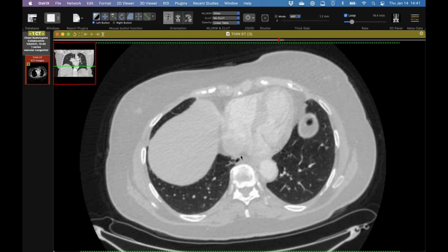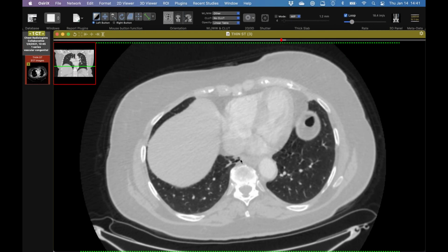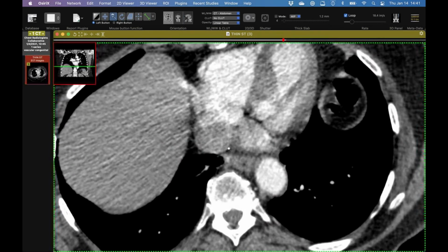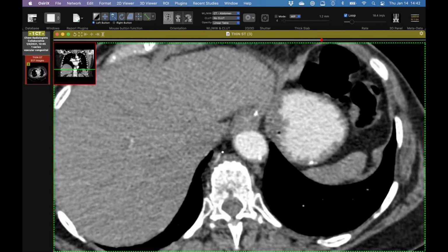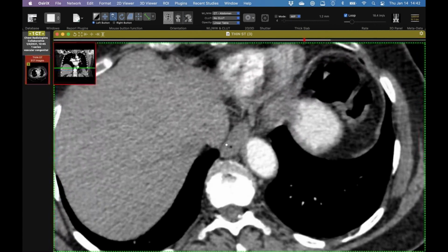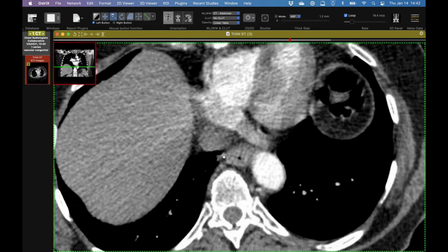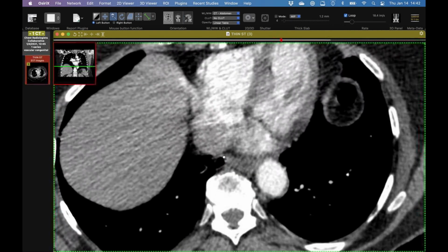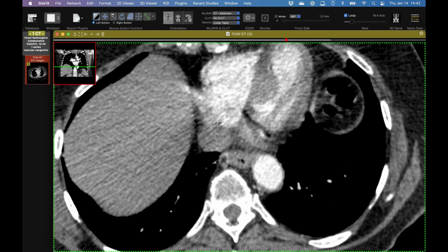All right, and then these three cases are sort of related. They're all vascular anomalies that I happened to come across in the last couple weeks. So this one is a cool one. My colleague Daniela ran into this case. She saw this funny looking vein here, and you see there is just a little vein that drains into the right atrium from the right lower lobe, but you'll see it's quite big for just a little pulmonary vein. And then there's this area of lung down here that's a little hyperlucent. And then you'll see there's the funny vessel, and unclear if that's airways or some kind of cystic space down there, but something's funny. And then let me just make this a little bigger.